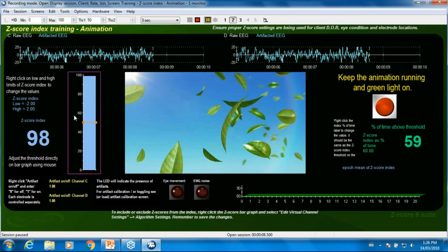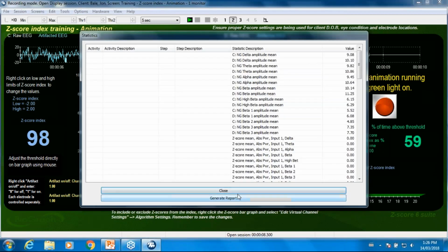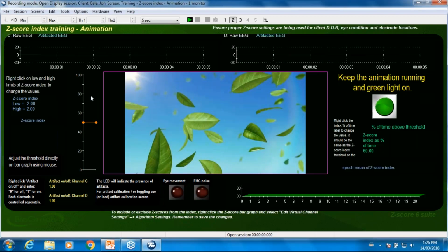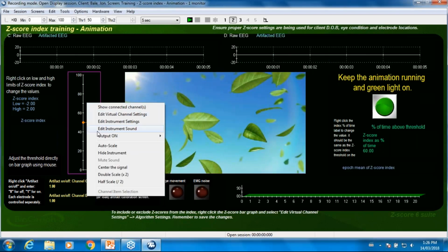The feedback component for this is that whenever the percent of statistics within the norm rise above whatever threshold value we set, the animation plays or the music is heard or the video runs and things like that. If ever we wanted to perhaps modify the session to not train every single statistic, but maybe just a lot of them, we can actually do that pretty easily.